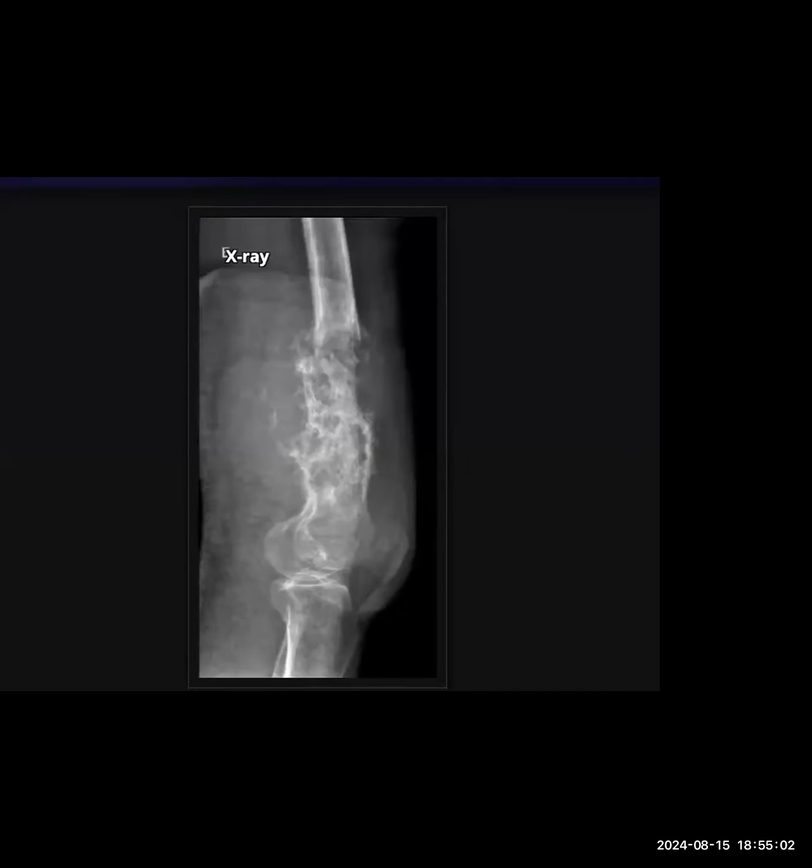So I'm presented with the lateral radiograph of the knee of a skeletally mature patient. The glaring finding here is the presence of a permeative lytic lesion in the distal diametaphysis of the femur, causing bony destruction and extension into the soft tissues.